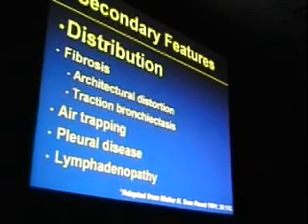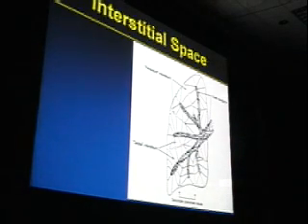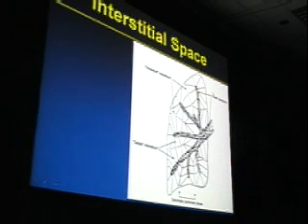Before we get started, I want to emphasize distribution a little more strongly, because that is a critical and key component of constructing a differential diagnosis of ILD based on high-resolution CT scans. We can conceptualize the interstitium not as a single uniform compartment, but as composed of 3 individual compartments, which were labeled by Dr. Weibel as the axial interstitium, the peripheral interstitium, and the septal interstitium. These are 3 distinct compartments, but they interlock to form the entire connective tissue network of the lung.